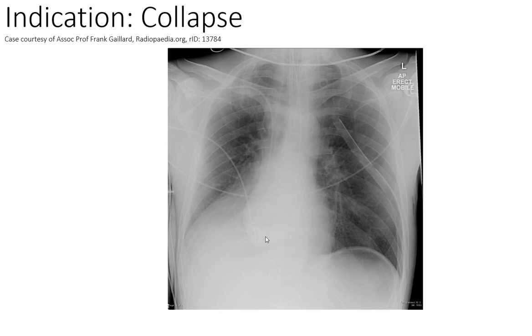Now that might suggest that you've got somebody who's got an atelectasis or collapse on the right hand side. In conjunction with this, it might make you think, oh, was there some kind of a tension pneumothorax that pushed everything off to the side and everything hasn't re-inflated again yet? And is this a massive atelectasis down here? Some of that does have to be taken with a pinch of salt because of this rotational element. It's hard to know how that's affected the shift of structures.